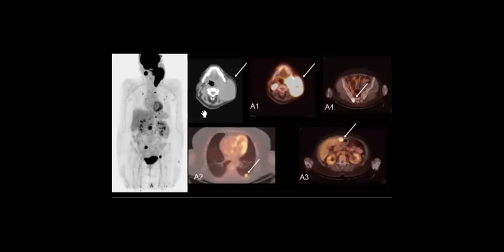And when you start to consider it as a mass, how do you describe it? So left neck mass. Do you think that this one is from the bone? Do you agree? I think it is not a bone lesion. It looks like a soft tissue, right? Soft tissue lesion.